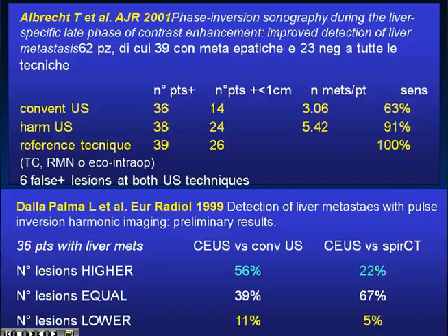You may wonder why. How can it be less sensitive? The problem might be, especially with the first equipment, that if you don't set your equipment perfectly and the lesion is very deep, when you have a lot of contrast, it blocks the ultrasound waves. They are not able to go very deep. And so something that might be visible with ultrasonography might not be visible anymore with contrast-enhanced ultrasonography, because you have not set your equipment in the right way to penetrate deep enough. This is the reason why there are some cases that might be seen with ultrasonography and not by CEUS. But if you set your equipment perfectly, then this number should tend to be 0.